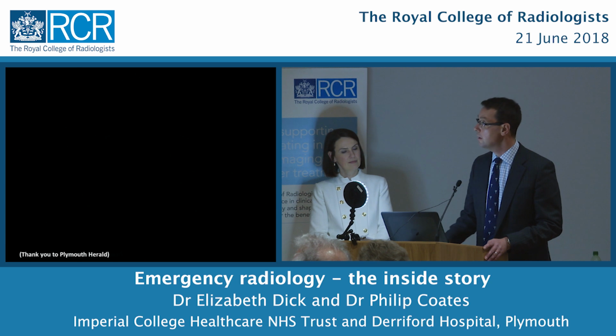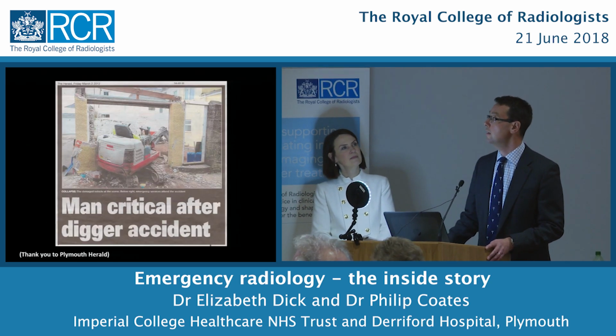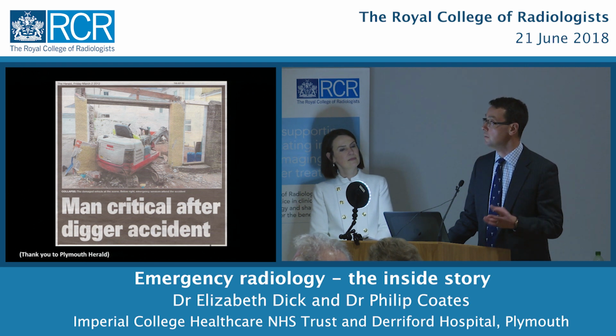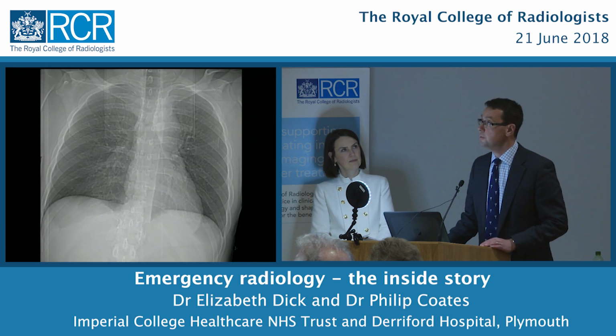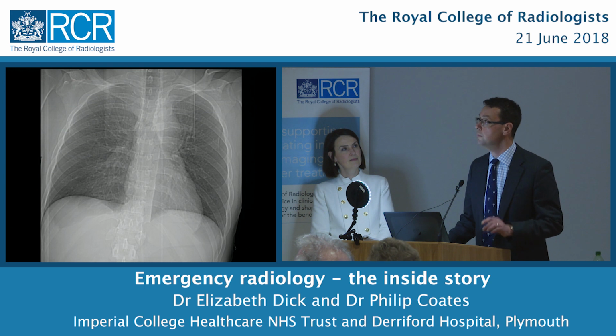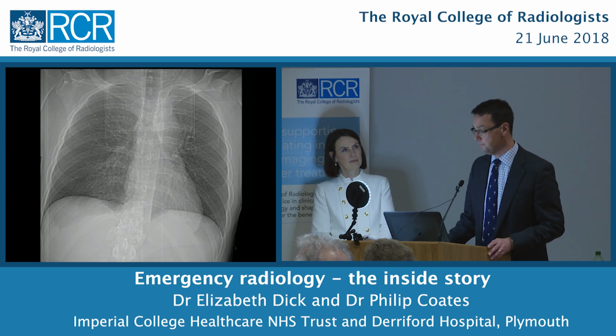Thanks to the Plymouth Herald newspaper who provided this image of that actual injury, of that actual accident. He's come in and he's had a supine chest film, so he's lying down with this chest film. There's actually quite a bit in terms of the clues to the initial injury and future management from this.